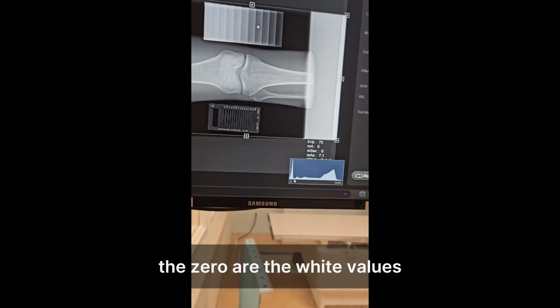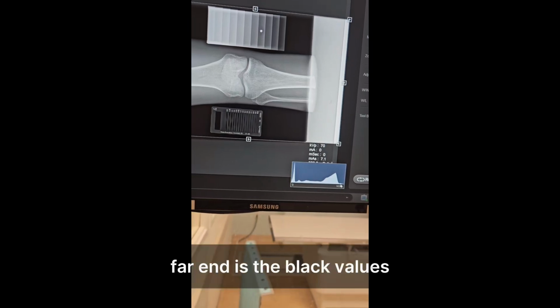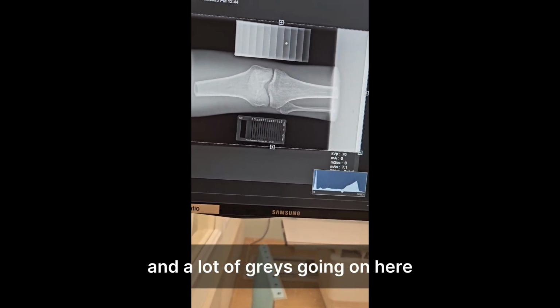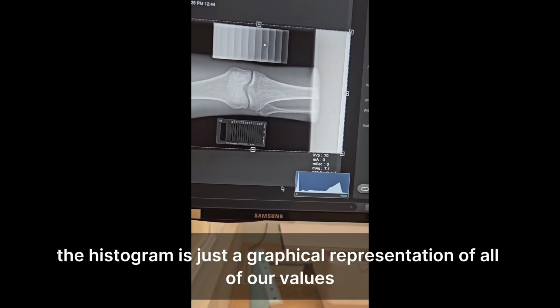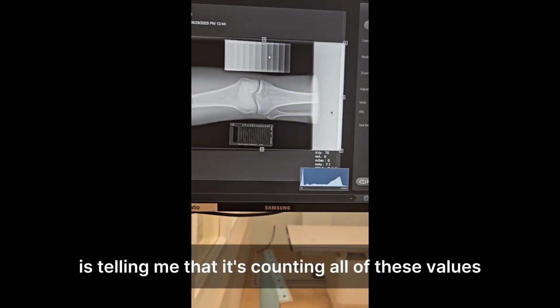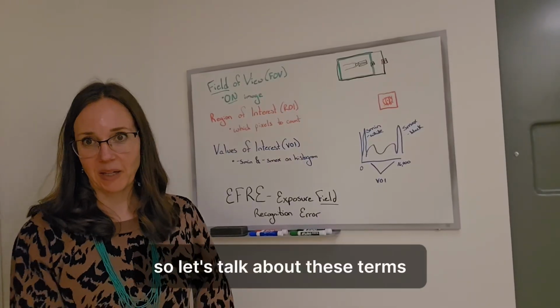The 0 are the white values, so it's counting a lot of white values. The far end is the black values. We have a lot of dark grays and a lot of grays going on here. The histogram is just a graphical representation of all of our values, but the big white values here tell me it's counting all of these values.